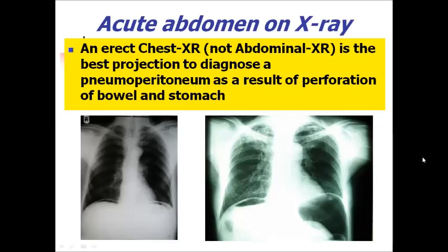If your patient is suspected of perforation, and if he can stand under the beam during examination, put him under the X-ray beam and take an X-ray film. The presence of free gas under the diaphragm domes is always pathological, and this problem is surgical. This patient needs urgent consultation with a surgeon and maybe immediate operation.